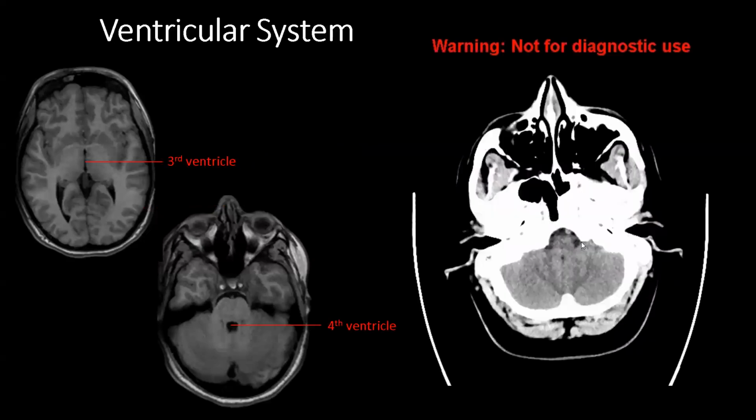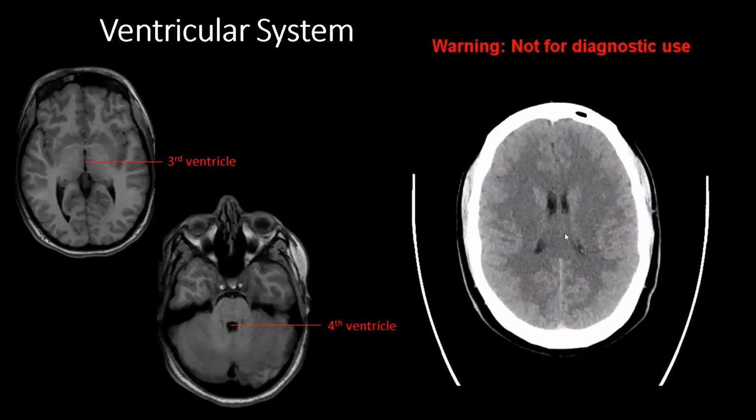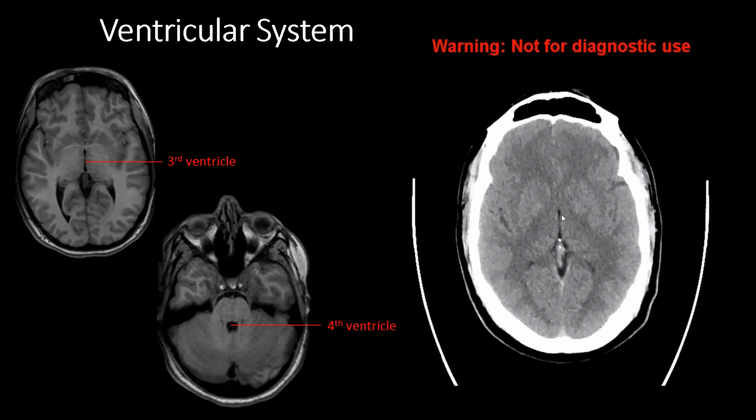As we move down from the lateral ventricles more inferiorly in the ventricular system, we'll then encounter the third ventricle, which the lateral ventricles drain into. And that is this thin, small CSF attenuating structure just interposed between the two thalami. So that's your landmark. Again, quite small, especially in healthy patients when it's non-dilated. It's just this little structure here.